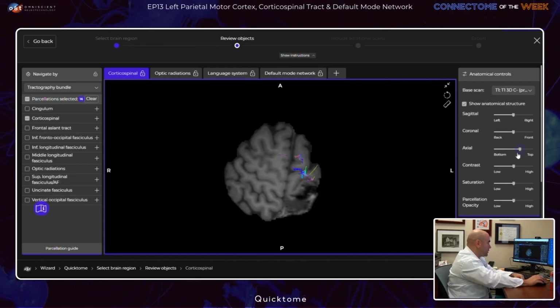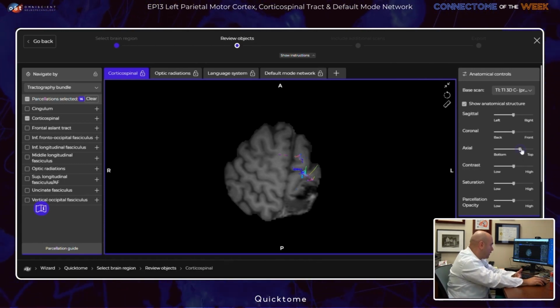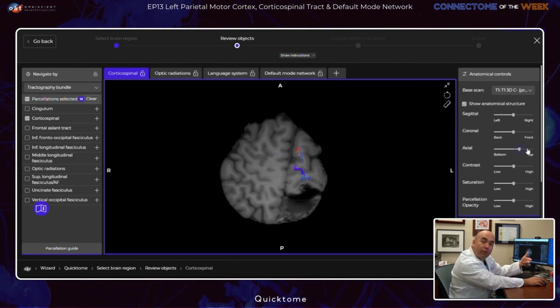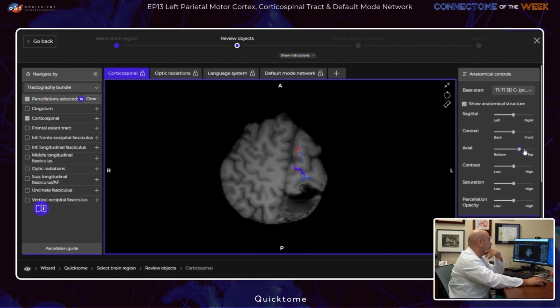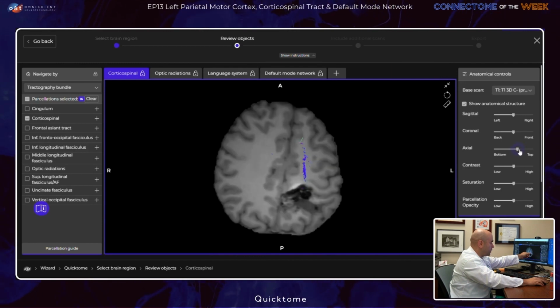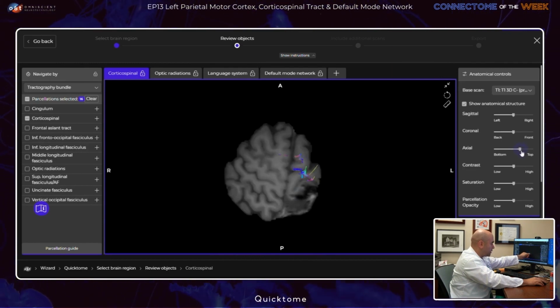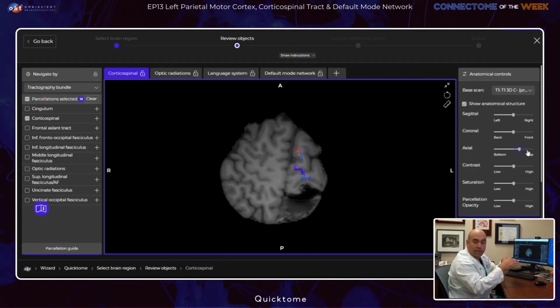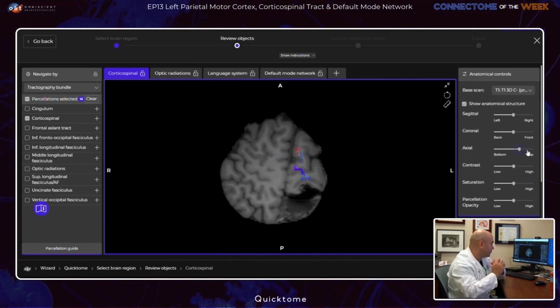What I could show you here is essentially what you'd expect because the patient was intact postoperatively. We were able to carry the resection, as you see, really right up into that little nook, which is where you could appreciate some extension and perhaps even infiltration on the preoperative MRI. And importantly, you can see the corticospinal fibers traveling intact, not disturbed, clustered, essentially identical to what they were preoperatively.